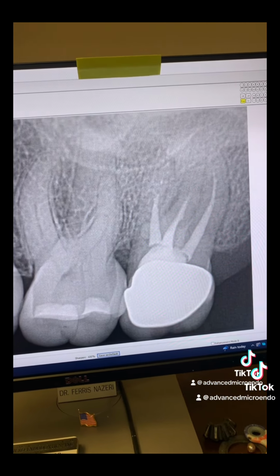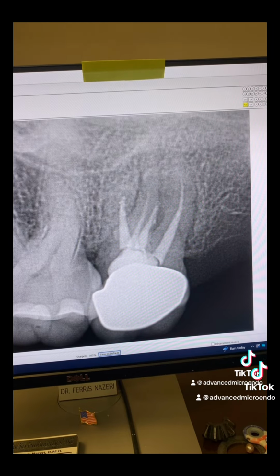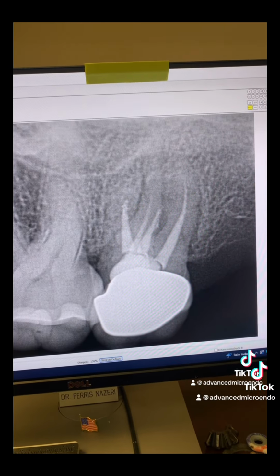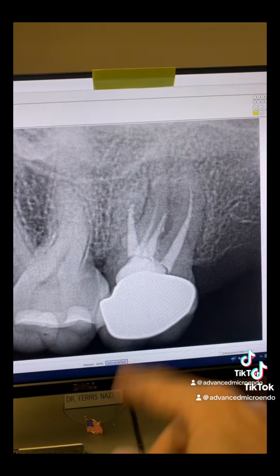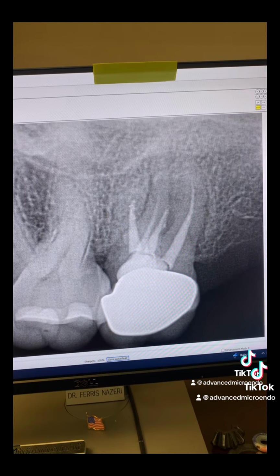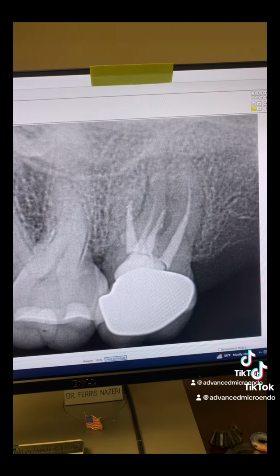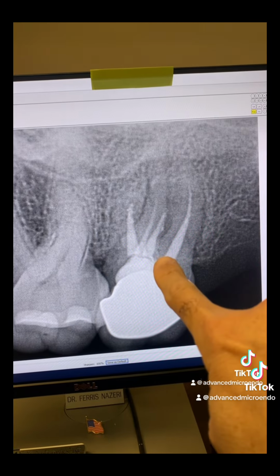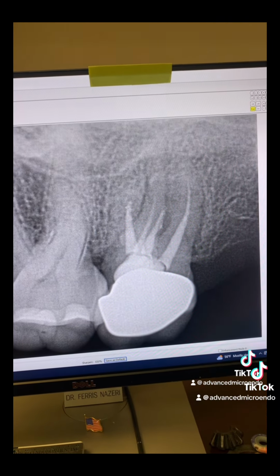But if he had followed me just like you guys and listened to me just like you guys, paid attention to these stories and taken a mental note, then he or she would have taken a couple more angulation PAs and noticed that. And sometimes you take x-rays, but if you don't know how to read them, you can also miss it. You can take 100 x-rays, and if you don't realize that this is a perforation, then you miss it. But here it is.